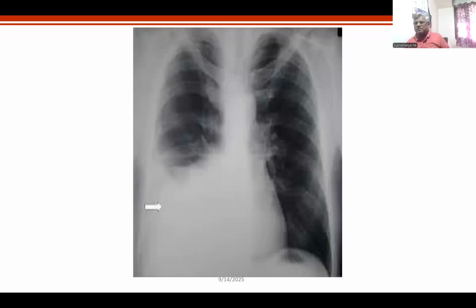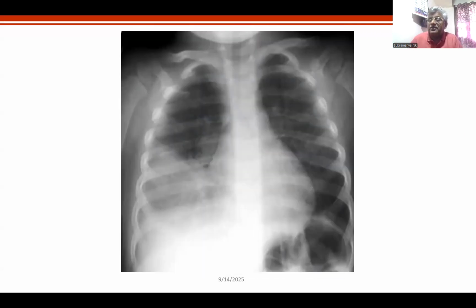Okay, so commit, no problem. Commit now. I'm not criticizing any one of you. All of you are correct. When you say effusion, you are correct, right? This is effusion, right? I'll go to the next film. Now, is this effusion or pneumonia? Please type. The second one.